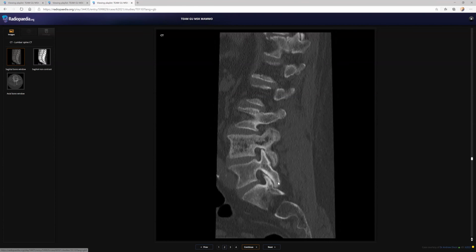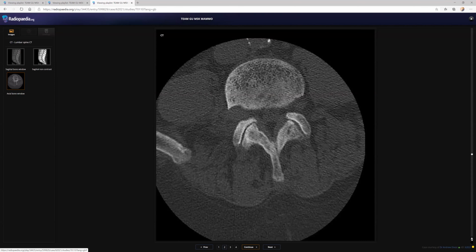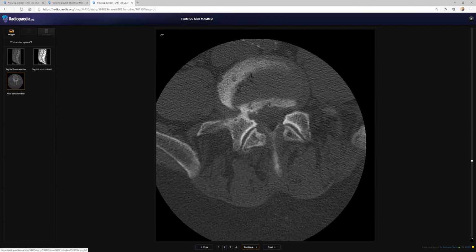Can I see the axial section as well? Sure, you can take the axial. So this could be a hemangioma, as this is not causing any ballooning, but the appearance it is giving is heterogeneous. So you can move up and down. You can click first and move.